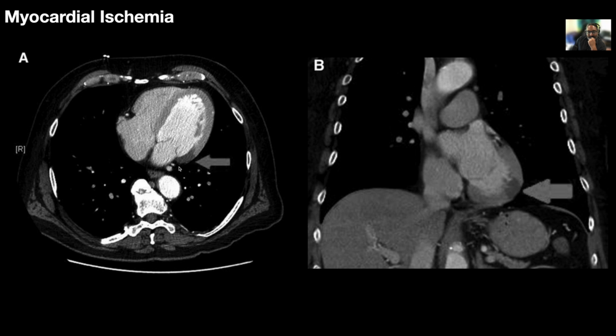Would you say that that's ischemic versus infarction? You know, I can't say. I actually think an early ischemia wouldn't show up on CT, but a late ischemia would, and that would be an infarction. So I actually think that is infarcted tissue. It may not actually be ischemic tissue. So I am going to have to query infarction, because it very well could be.